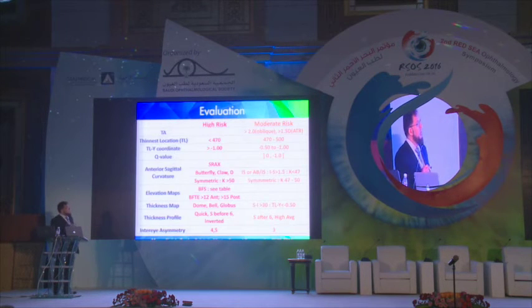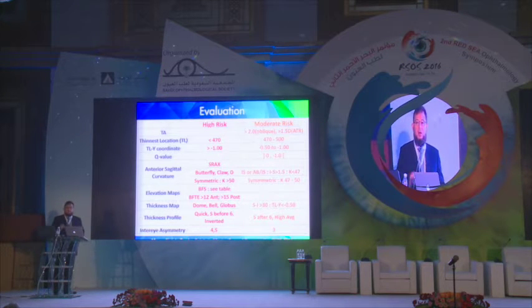This is the summary of all the risk factors, but you may ask, where is the low risk? As you see, high risk, moderate risk, and low risk. Actually, low risk is given for any very normal case, because as you know, refractive surgery is not risk-free.